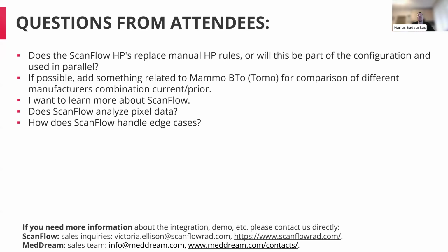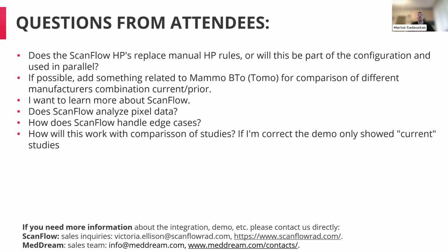As mentioned before, it is possible to use your created hanging protocols, which you create using the MedDream hanging protocols version 2, which is the newest one, and we recommend to use it. And you can have the ScanFlow hanging protocols also. So in principle, you can have both of them working, and it's not a replacement where if you have one, the other will disappear. So you can choose between all of them.